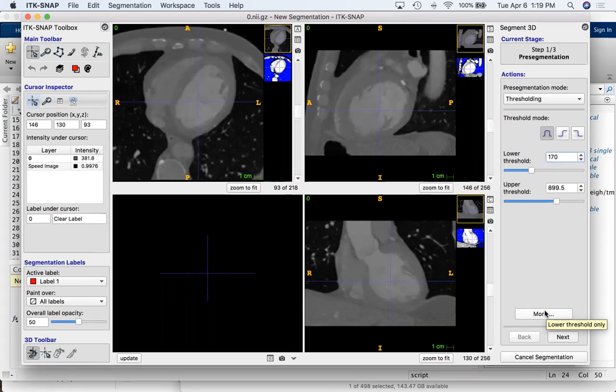Can you see which values you have in the ventricle? Oh, yes. I see they are around 400 in my case. I can show you. Yeah, it's 381 is what you have, right? Is that the mean in your ventricle? So which case are you looking at? 71. 71, okay.